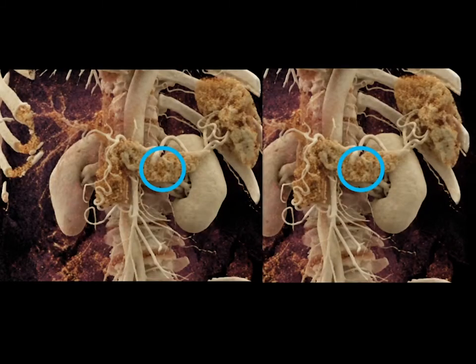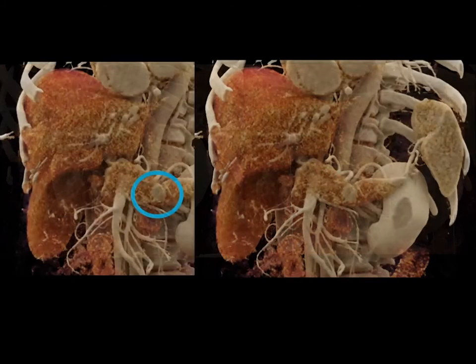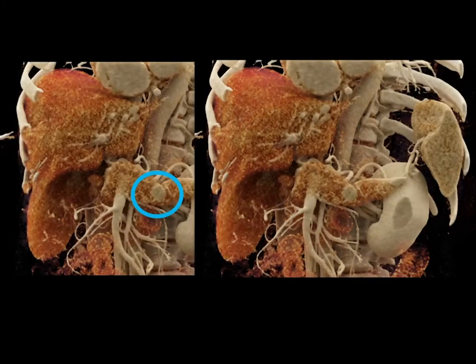And here you can see arterially there are textural changes in the gland. That should be clear. And then when you go from arterial to venous, look how the mass is shown as an enhancing structure. Very nicely shown. You can see how invisible it was initially, but look at the detail of the vessel.